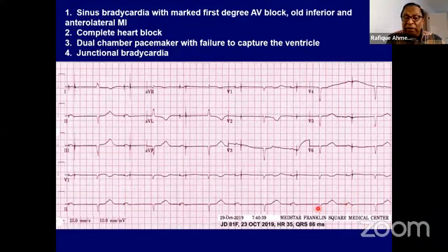So this is a ventricular timed rhythm. And there are other types of pacemaker which do both or atrial timed, depending on the manufacturer. So that's why the timing is like this, that it is pacing AV. Otherwise, you would have assumed if it were triggering from this, the atrial pacing would be after 1 second. But no, atrial pacing was earlier. It is a ventricular timed pacemaker. And the same thing can happen like VDD pacing or DVI pacing. Thank you. So again, what is the etiology of this?